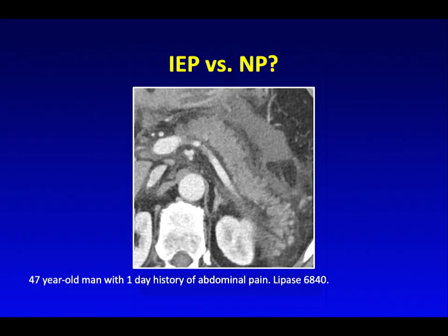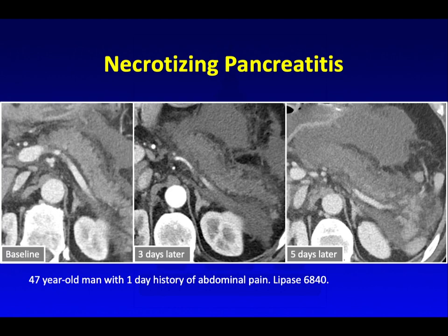How about this example? Do you think it is interstitial edematous pancreatitis or necrotizing pancreatitis? This time I actually gave you contrast, but the patient is coming in on the first day. Alright, so the answer is this is also a case of necrotizing pancreatitis.